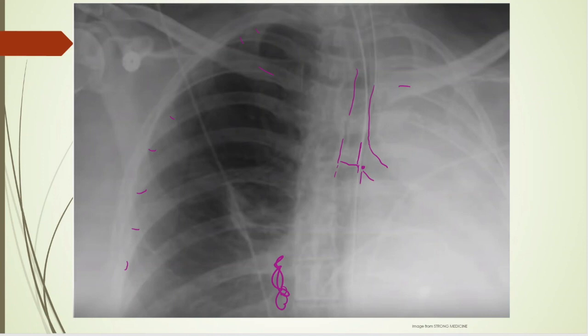And this here also would be where ultrasound would shine, because you could pick this up in seconds with an ultrasound instead of having to get a chest X-ray, which takes time, and get it back and get it where you can look at it and so forth. If there's any doubt, you could pop an ultrasound on here and in seconds see that this left lung is not ventilating, the pleura is not sliding, and then you could run through your differential of, well, why not? Remember, with ultrasound, you can rule out a pneumothorax. You cannot rule in a pneumothorax unless you find a lung point. Of course, that's for a different lecture.